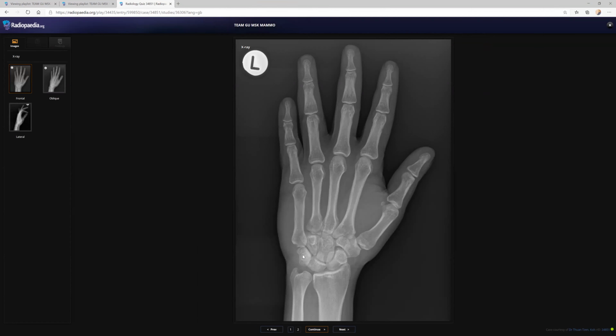And here, what we have to see is the arches, like Gilula's arc 1 and arc 2 and all. And you have to also see the lazy M. Here, the lazy M is broken.